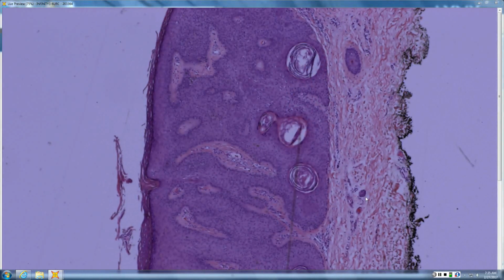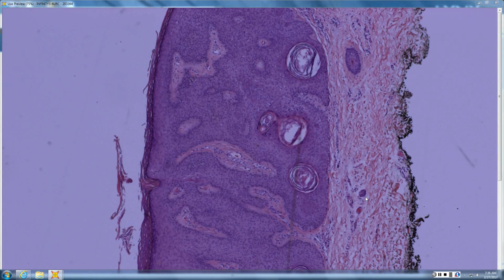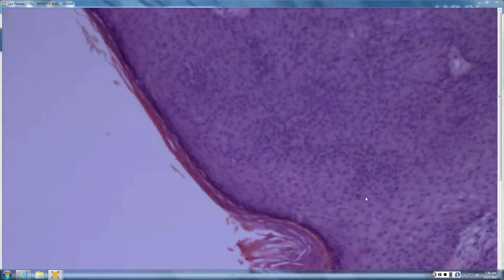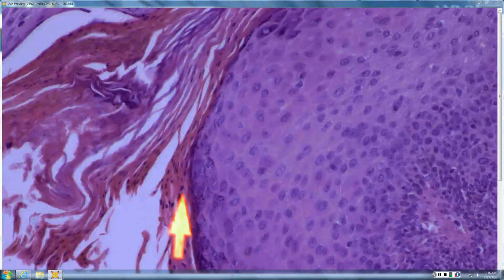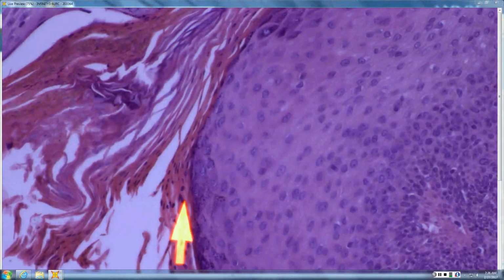So you very cleverly and correctly pointed out that even though it looks like a seb on architecture, there are parts of the body, like down there in the privates, where things can look like a seb but not really be a seb. And the hint is typically in the corneum. A seborrheic keratosis has a corneum that is shredded wheat lamellar, and if you look at the corneum here, not only is it compact, but the parakeratosis is distinctly round.